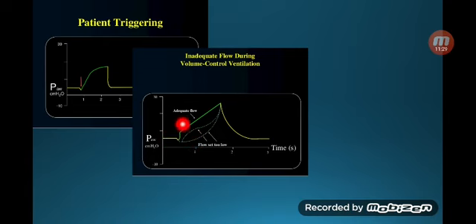So this is how it should be if the flow is adequate, but if it goes anywhere like that, then you need to get the flow higher. Again, we don't really use that much in peds, but also just in case you're using an old ventilator and using volume target modes for some reason.